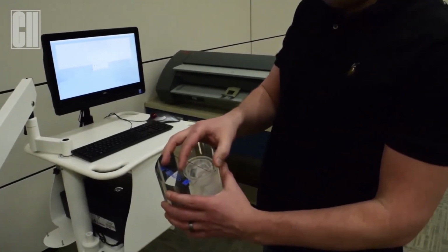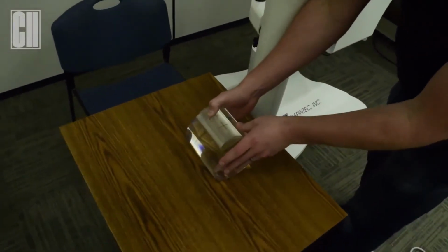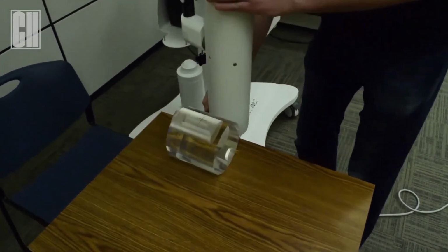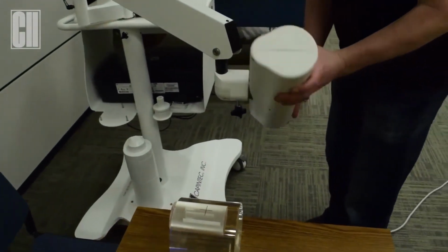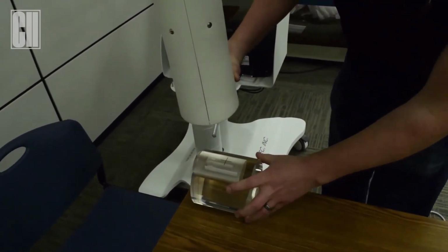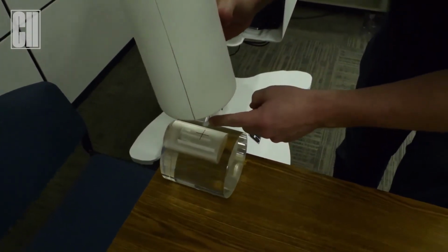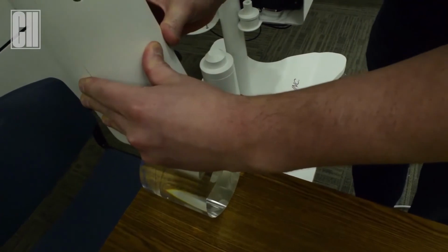So when we have the capsule lined up, in this case we're going to lay it on the table, down, and aim for our center point. So our goal is to get the line of our pointer rod directly in the center of that cross.